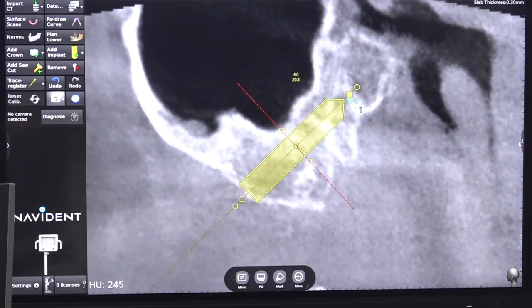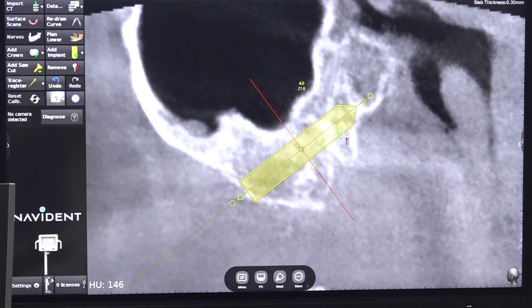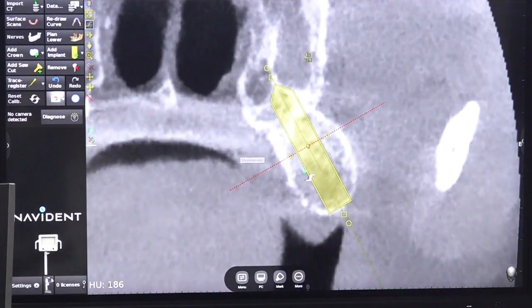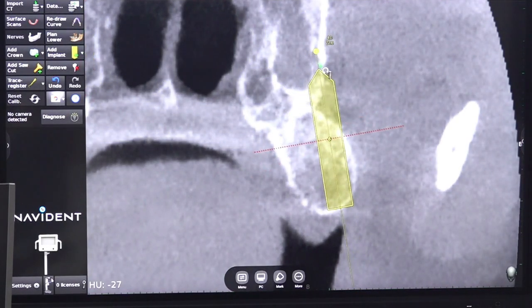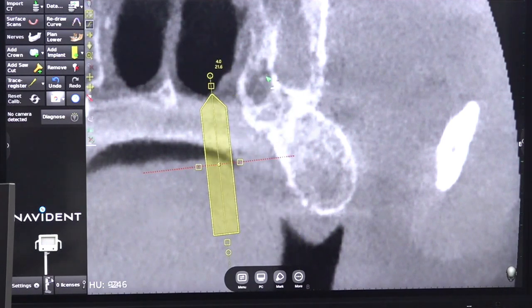Based on the classification, it is PRP 1 type. Okay. So from the second molar we are starting. The ending point is in this radiopaque zone or the junction zone or the pillar zone. So in the buccopalatal angle, this is the correct angle. If you go straight, we will go into the dangerous spaces, infratemporal space, or into the lateral pterygoid plate, which is not desirable. So this is the lateral pterygoid plate. This is the medial pterygoid plate. This is the pterygoid fossa.